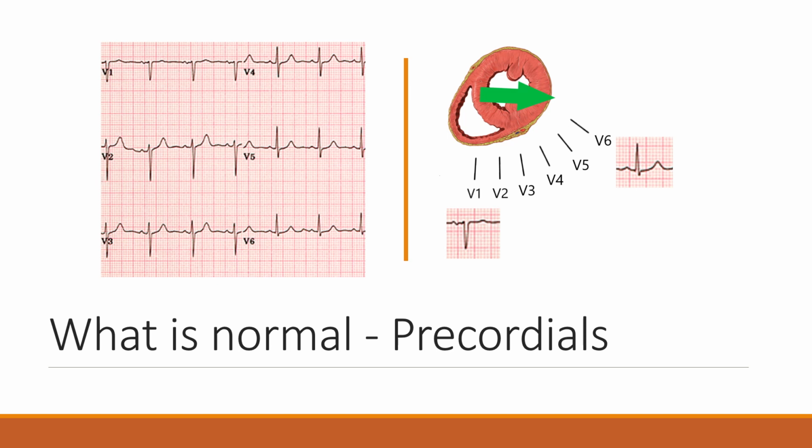If your anterior wall starts to die from an acute anterior STEMI, you will eventually lose the R wave in V4, because the R wave in V4 is produced by the anterior wall of the ventricle. And if it's dying, it may not be making energy anymore. In fact, that will be a permanent change in anyone with an anterior STEMI. If it progresses long enough, the R wave can be permanently lost, and the patient will always show poor R wave progression on their ECG.